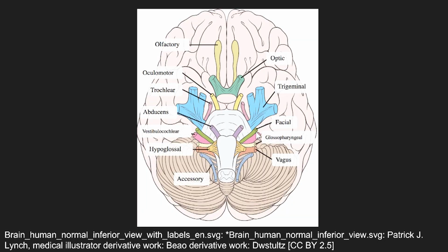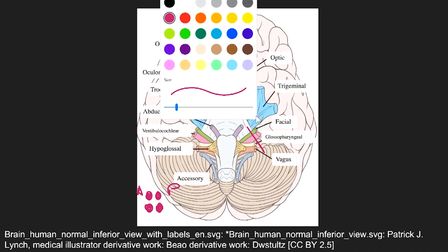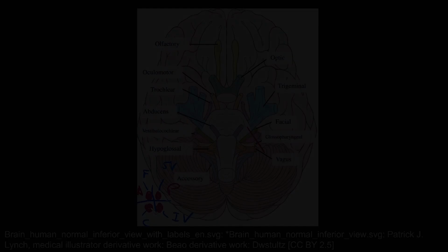So if you were going to produce a sagittal section of this area, something like this, or a sagittal oblique, and you were looking along the sagittal, this would be anterior, this would be posterior, so you'd have 4 nerves. There's 1, there's 2, there's 3, there's 4. And what are those 4 nerves? Well, those 4 nerves are 7 up, facial nerve, anterior, Coke down. So this would be facial, this would be cochlear, and in the back you'd have superior vestibular and inferior vestibular. These are actually going to be divided up by the crista falciformis horizontally and Bill's bar vertically. Let's move on, shall we?